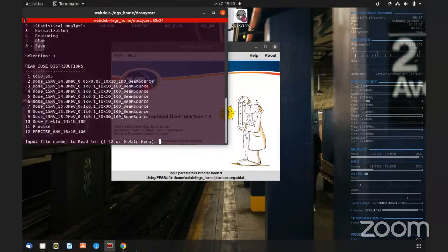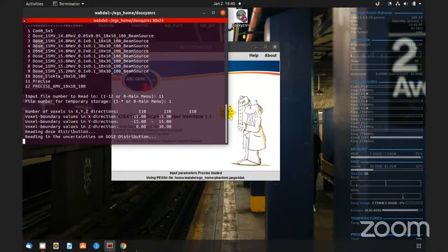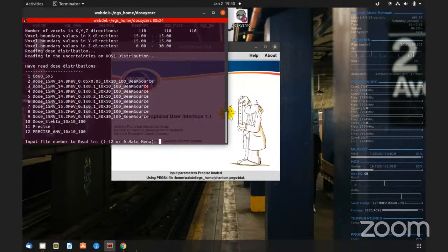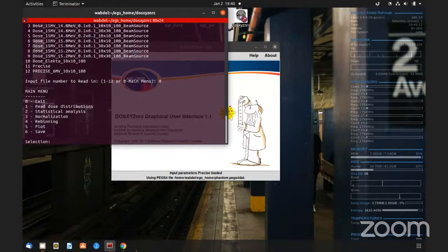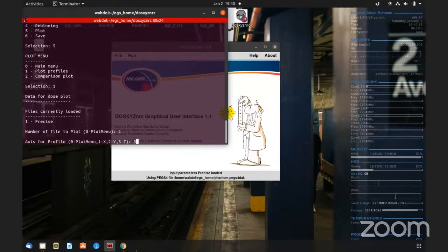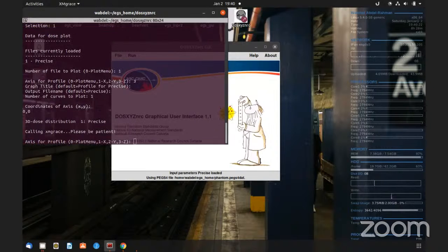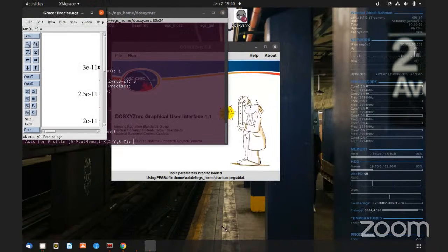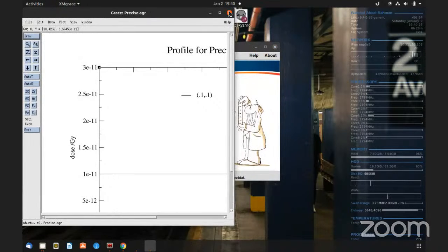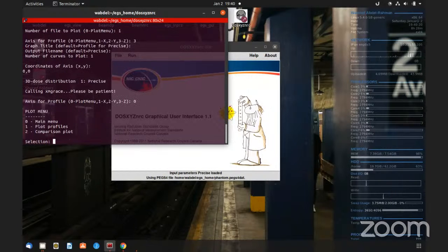And we're going to read. So it's 11. Plot. And then we go back. So 5 top. Okay, again, nothing is there. I'm surprised. This is the issue I was facing. Let's look at statistics.